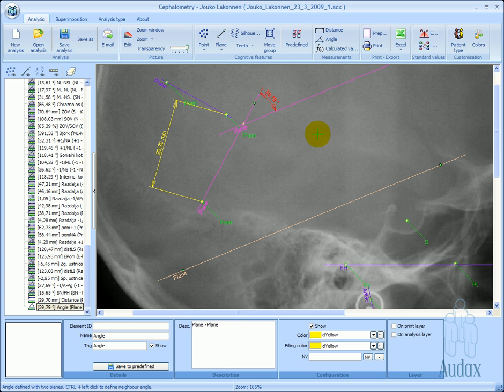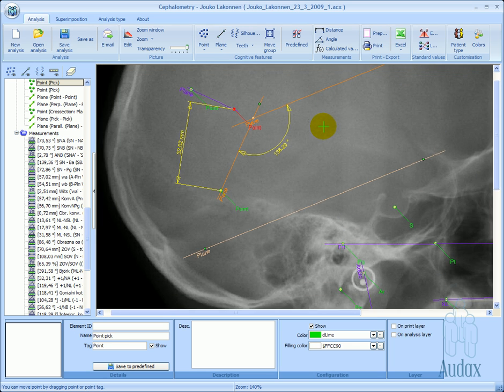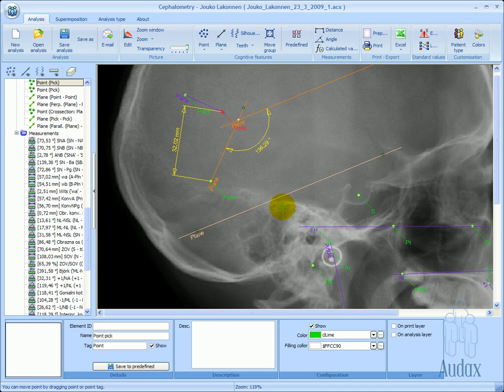The same is true for the angles. We can place the angle measurement between 2 planes or between 3 points. We can change the measurement to be for the supplemental angle by issuing a simple command if needed. The measurements are being refreshed while moving the geometry.